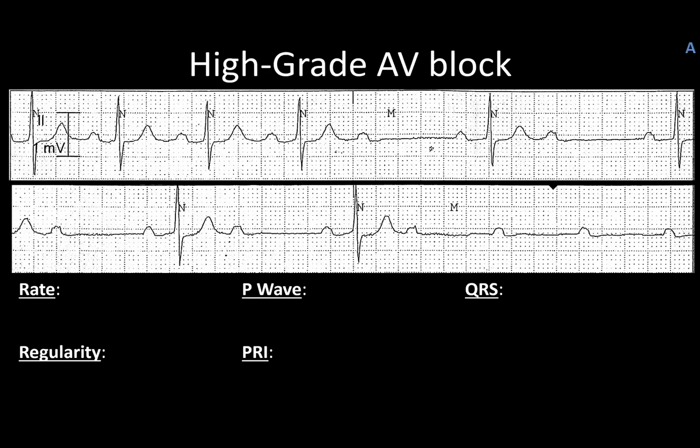All right, so this is one of the many strips I've collected over the years, and this one does a really great job of illustrating how blocks can progress, sometimes rapidly. I'm going to go through and get this one marked up, and then we'll talk about what exactly is going on. To start things out with, these are a little bit longer than 6 seconds by a hair, just to help make sure that you can see what's going on.